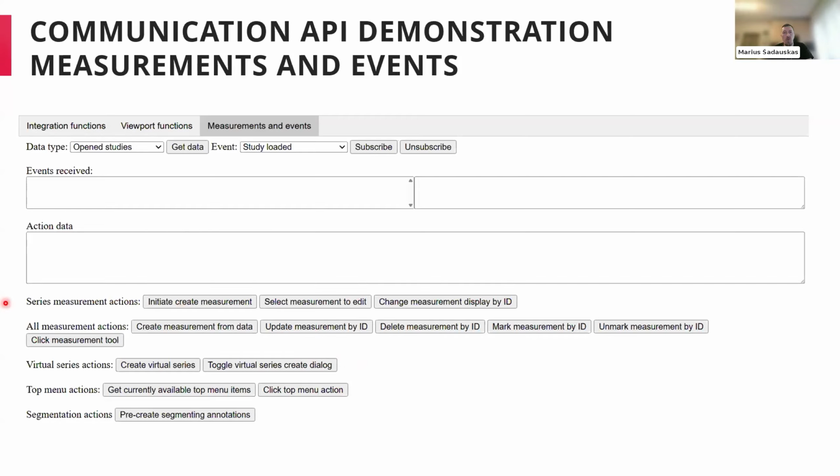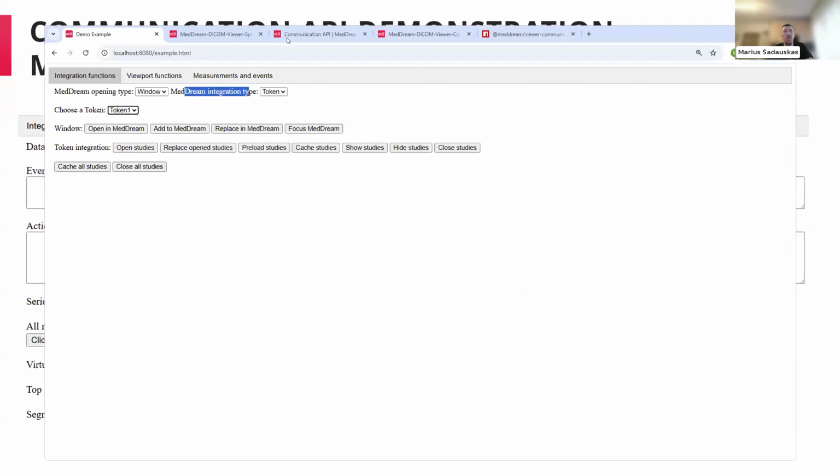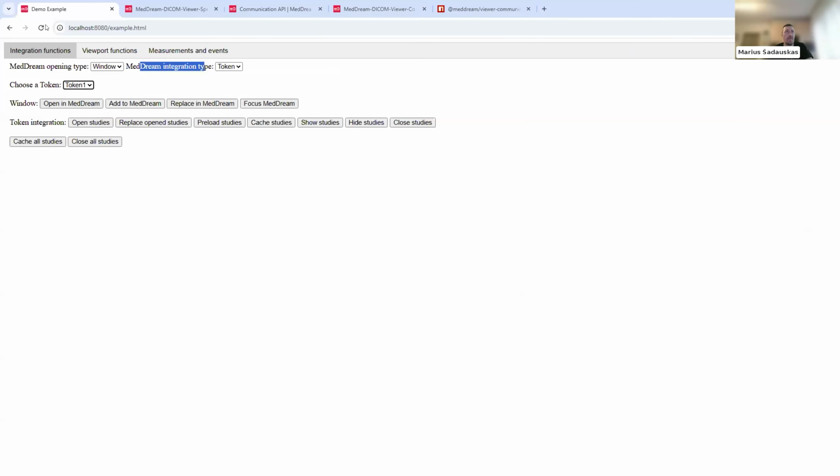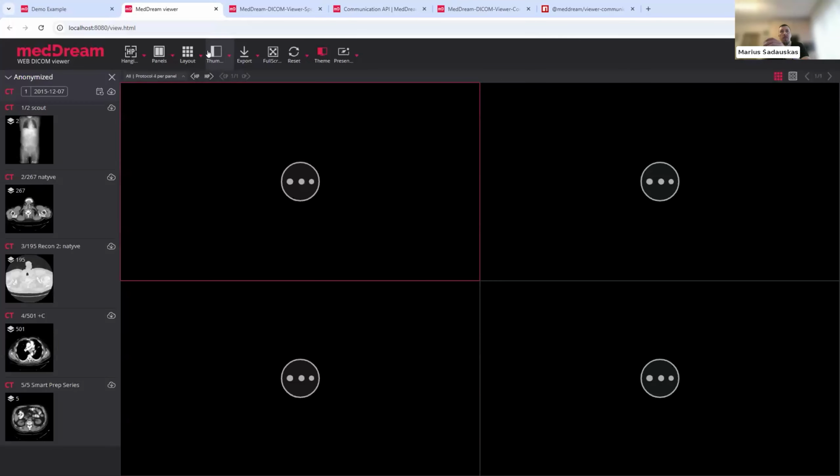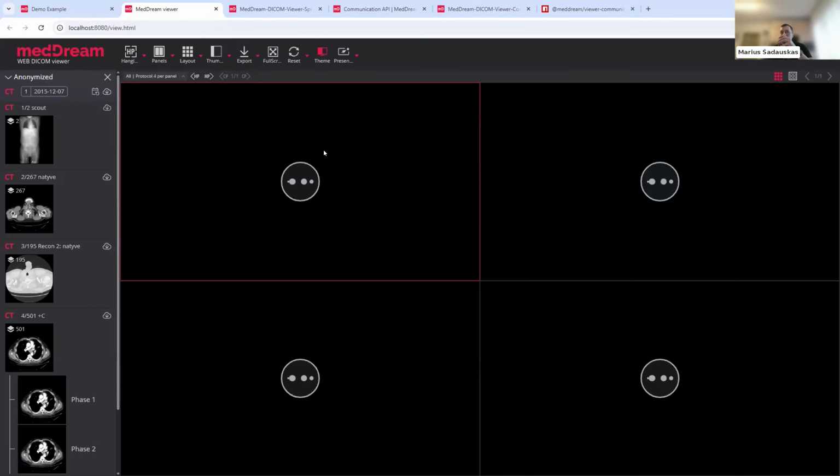So now let's go through this actual demo, and I will demonstrate some of these examples. I have this demo here up and running, and using this communication API, I can open a study from this demo page, and it will load me a study which I requested.